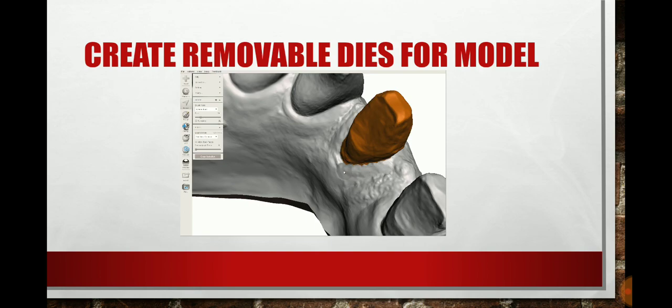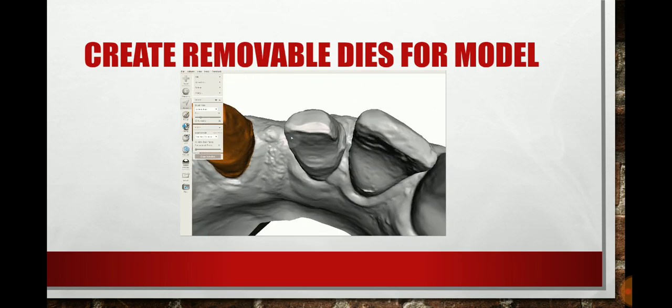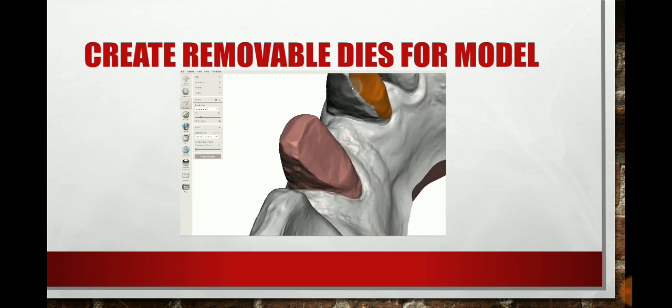More so on the mesial there. I know a lot of people are probably looking at this one like, who prepped this? But what they did was they wanted to keep this shell as thin as possible, because they are going to try and restore these two teeth, and I know they're really far apart. Ideally, I would have said, let's go ahead and do ortho first. And then right there, you guys can see how it changes color. So now you actually have a face group on that particular prep. But yeah, I would have chosen to do ortho on these at first.